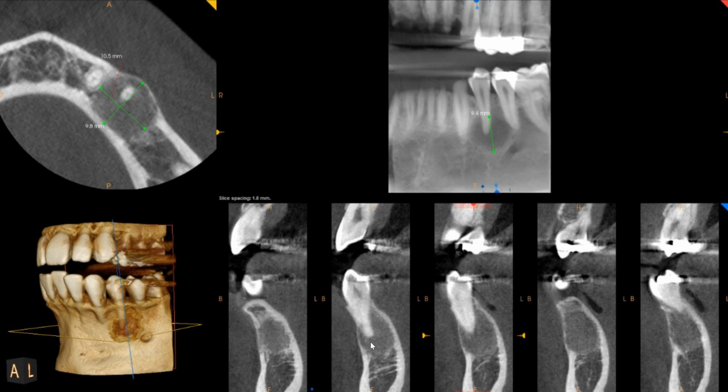So if you're in my D2 class, recently we discussed fibro-osseous lesions, right? And if you consider one of the fibro-osseous lesions, I think it's definitely an acceptable differential diagnosis. But for periapical osseous dysplasia, one feature that this doesn't fit very well is that it doesn't have that radiolucent rim, right? Doesn't have that radiolucent rim.